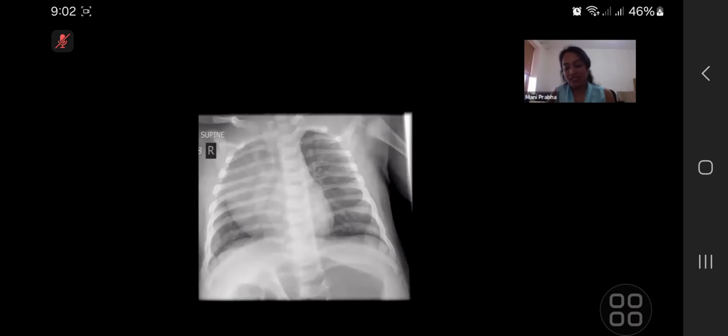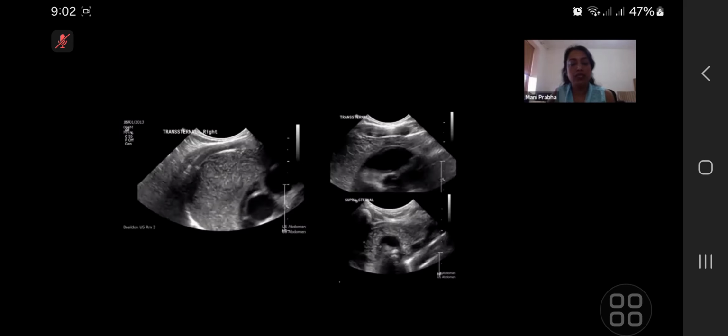So we did an ultrasound scan. As we discussed in the previous one, if there is a mediastinal pathology, ultrasound is very useful, and we really don't need to use CT in the first instance, because if ultrasound is able to answer our query, then why not use it? It's much quicker, doesn't need sedation, and we see a very homogeneous area just around the cardiac shadow, abutting it, very well circumscribed. So it is a thymus.